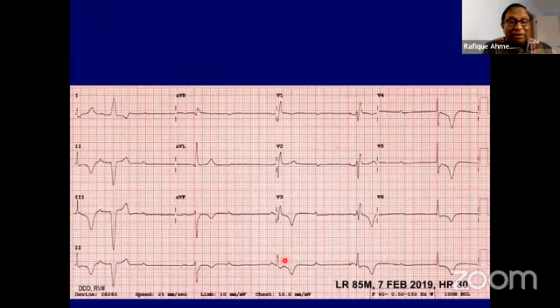So this is the other one. Look at this. This is a patient with dual chamber pacemaker who comes with syncope. And then there is a P wave, but there is nothing after that. And there is atrial pacing also. This pacemaker basically is not delivering any spike after the P wave. That means this was a patient with RV lead fracture. If there is a fractured lead, you will not see any signal at all. And it was programmed appropriately. Thank you.